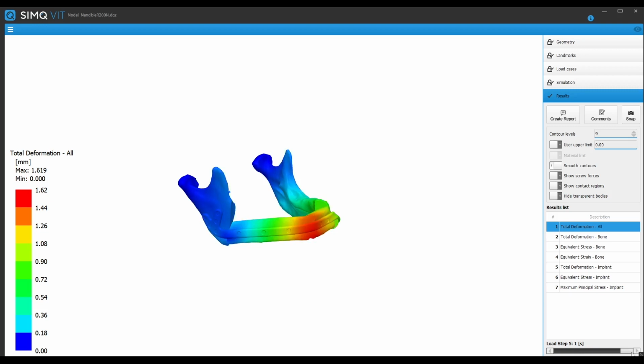With the total deformation, you can also check if it's deforming physically and reasonably. If not, there's probably an error in the inputs of the model, so it's recommended to change the inputs and recalculate to get the desired deformation result. The maximum deformation is indicated in red, so all the areas of the geometry that are in red have a total deformation of the higher millimeter range.